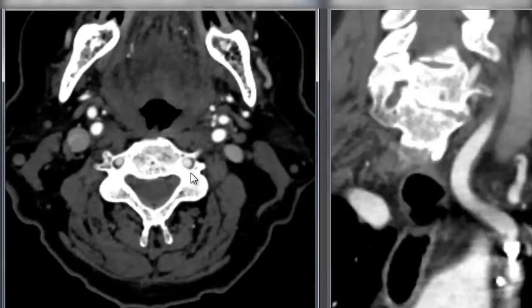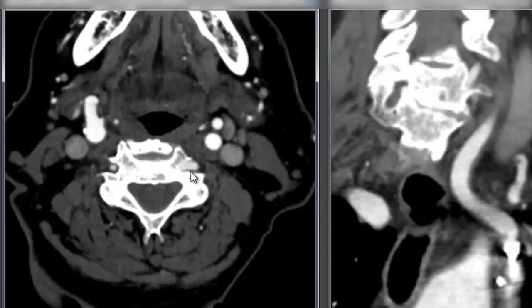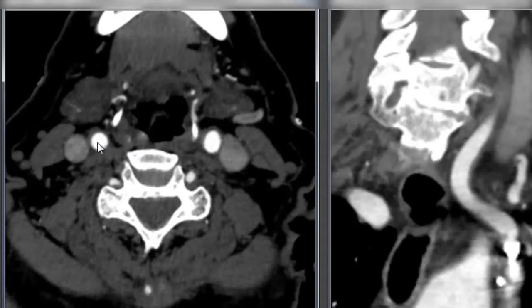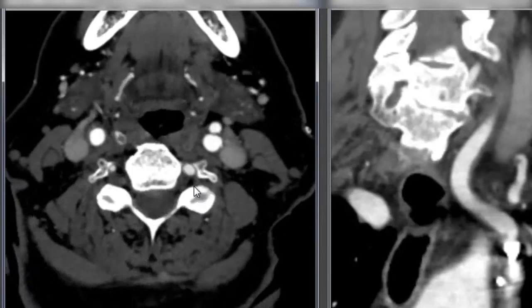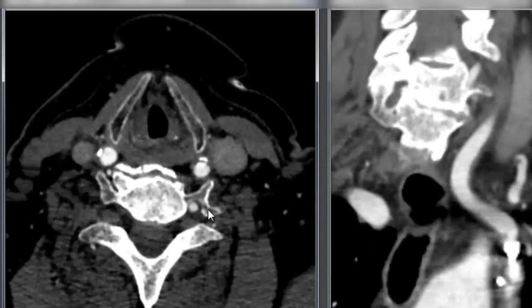We're going to focus on the dominant left, but you can see on both sides the vertebral artery is now passing through the transverse foramen of the vertebral body and the cervical vertebral bodies, and we come back down here, and then we see we're now at the level of the common carotid artery on each side. So this is a good way of orienting ourselves. We have the right common, right vertebral, left vertebral, and keep going down.